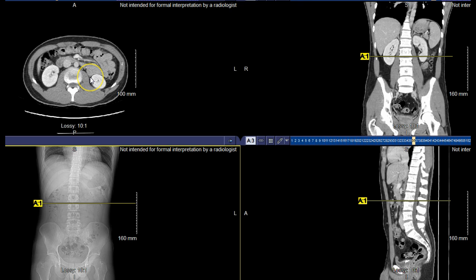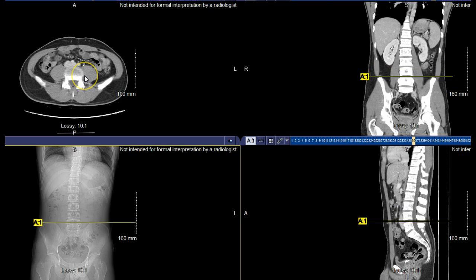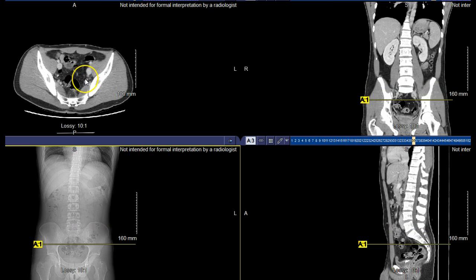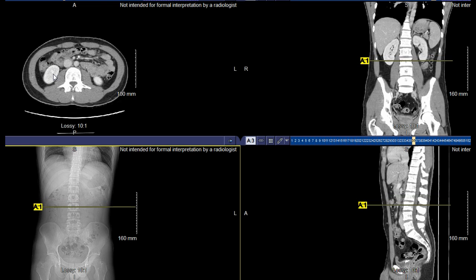And the contrast here, while it's a with contrast study, it's really not identifying the contrast on this particular phase very well at all, because you kind of lose out on the ureter, but it is right in there. Subsequently, you can kind of see how it follows and channels down the psoas muscles here as well. So you can kind of see it here and there. It's a little bit spotty, but eventually it will then transition down into the bladder. So those are really kind of the important structures more than anything else. Of course, understand the area, region of the hilum where those vessels are entering and exiting. And you can see the renal veins, renal arteries, and the ureter in those respective areas accordingly.